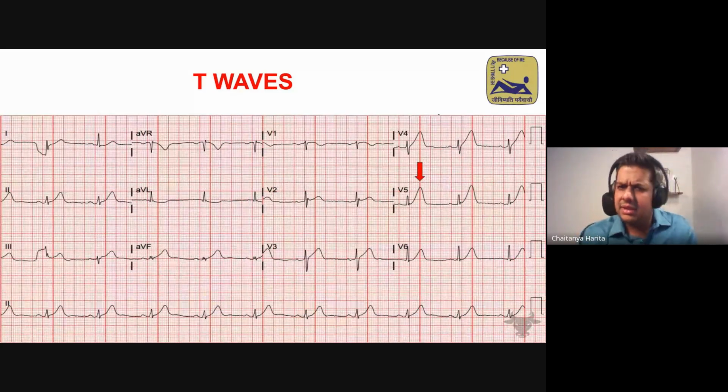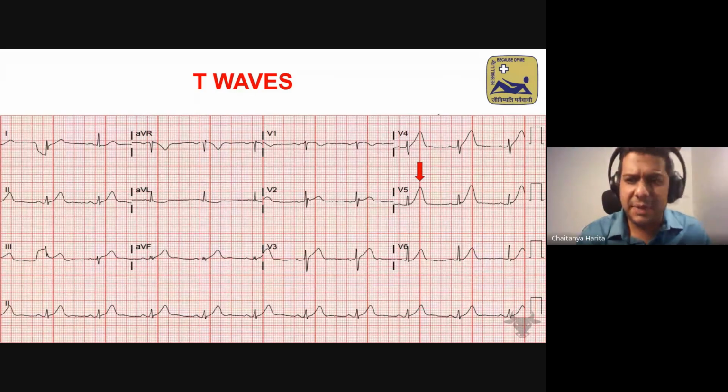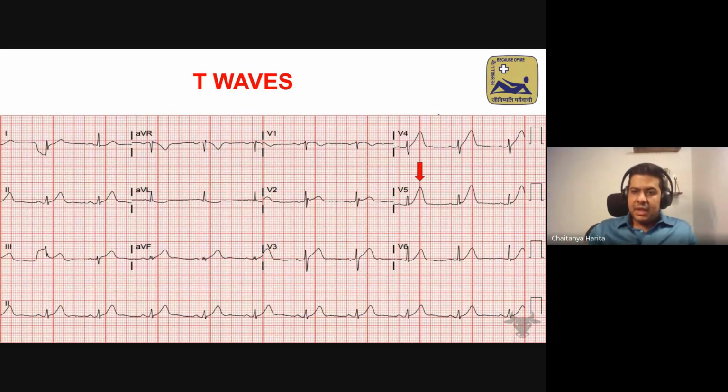Now you may wonder, sir, acute coronary syndrome MI has ST elevation or ST depressions? Not really. The first sign of an ST elevation MI is not ST elevation. It is a tall symmetrical T wave. The number of medical students and house officers who have sent me ECGs over the last 6 years that I've been in Johns with tall T waves, saying, sir, it looks normal, no?